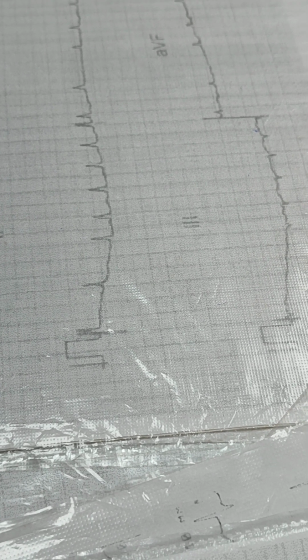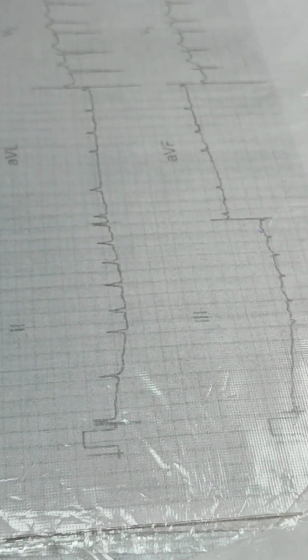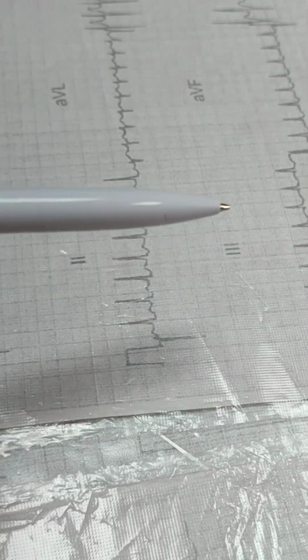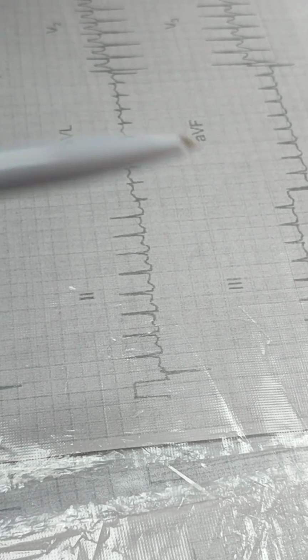Case number 2 on the blackboard. Atrial fibrillation. No P wave and irregular rhythm. F waves are invisible. Very short distances, yeah? So there is tachycardia. Complex is narrow. Tachycardia is supraventricular.